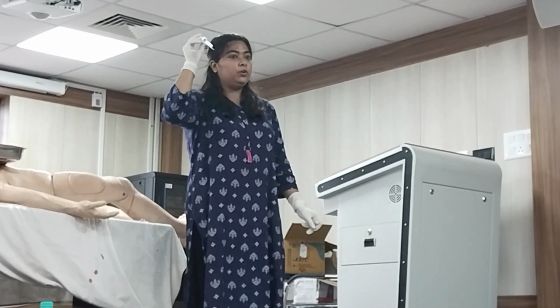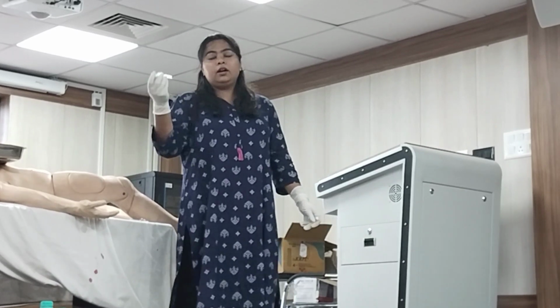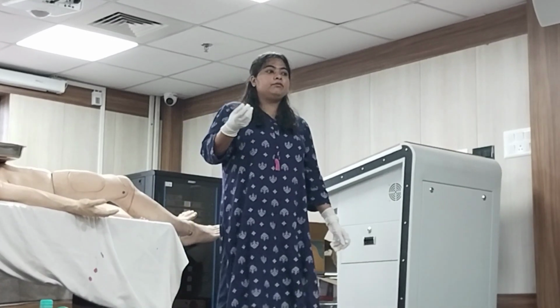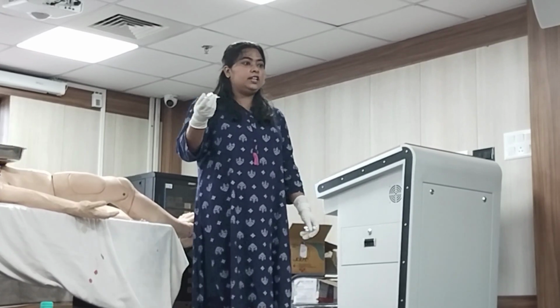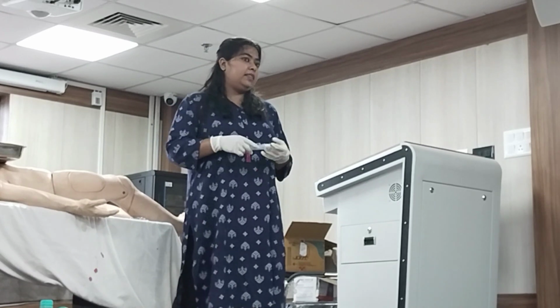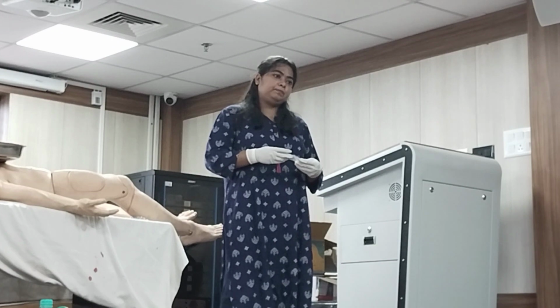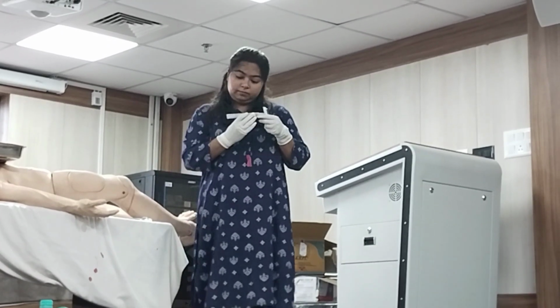This is the green cannula. The green cannula is usually given when you have to transfuse more amount of blood, more amount of fluid to the patient. So in the trauma department or in surgery department, in gynae, in anesthesia, we use this green cannula. And bigger than that we have the orange, also the grey cannula, which we will rarely get to see in the ward. So most commonly in the medicine ward what we usually use is pink and green, 20 and 18. Those are the commonly used cannulas.